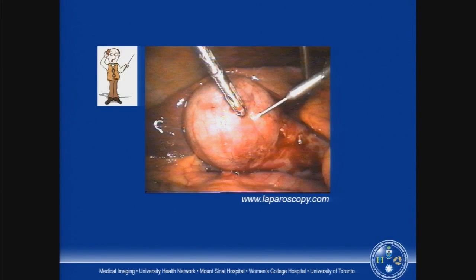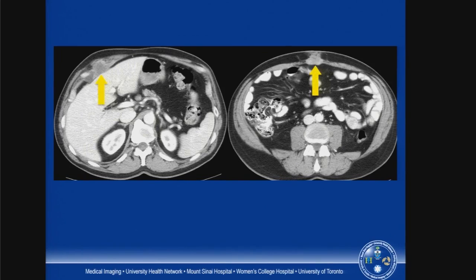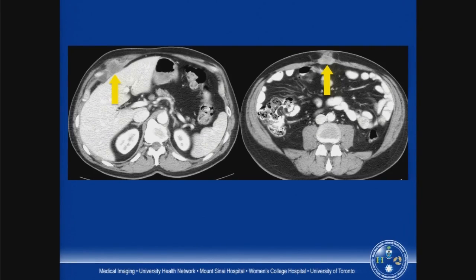Remember that today most gallbladders are removed laparoscopically, whether it's an elective cholecystectomy or in an acute setting, and we must always keep in the back of our mind the possibility of an underlying gallbladder cancer. Because if a surgeon removes a gallbladder laparoscopically and there is a cancer, and it's not foremost in their mind that there might be a cancer, it can have a bad outcome. This patient is 3 months post-laparoscopic cholecystectomy. There was a non-suspected gallbladder cancer in the specimen, and now we have seeding at the right upper quadrant port site and at the periumbilical port site.